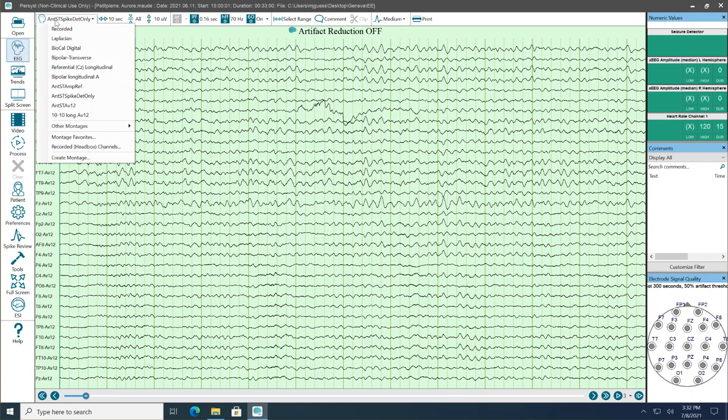Now there's a duplicate of this montage I've created called ANT-ST AV12. Normally you wouldn't put your detection montages in your montage favorites, but I have it there so I can get to it easy.